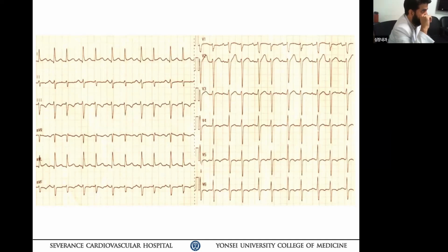With the gap phenomenon, the slower proximal conduction allows for recovery distally. So you will have a narrower QRS. Oh, that's why. That's because it gives the conduction system recovery time. Yes, so maybe that's why the second one is a little narrower than the first, but I'm not sure, depending on the refractory period.